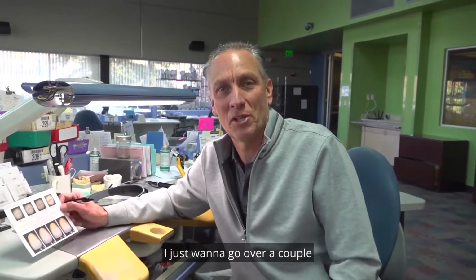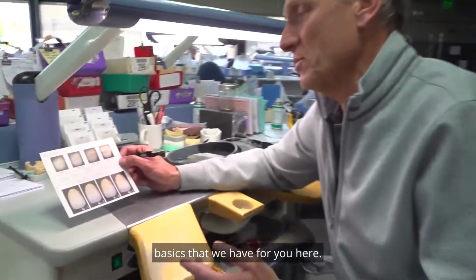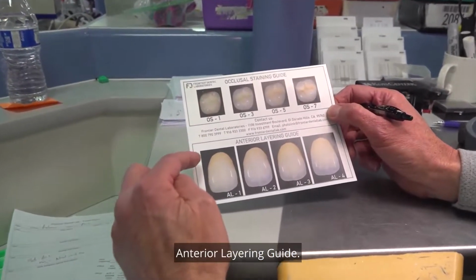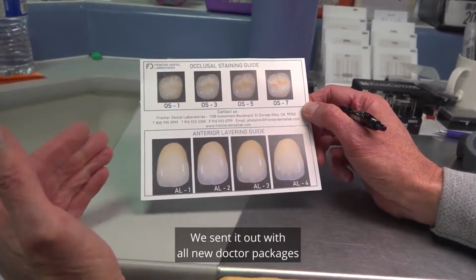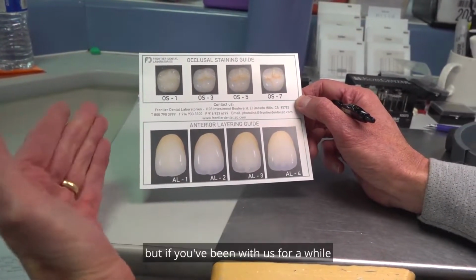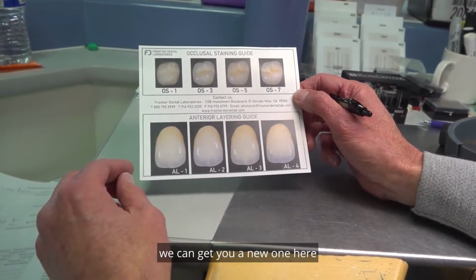Just want to go over a couple basics that we have for you here. This is our occlusal staining guide and anterior layering guide. If you don't have one of these things, just contact us so we can get this for you. We send it out with all new doctor packages, but if you've been with us for a while and yours is getting worn out, we can get you a new one here.